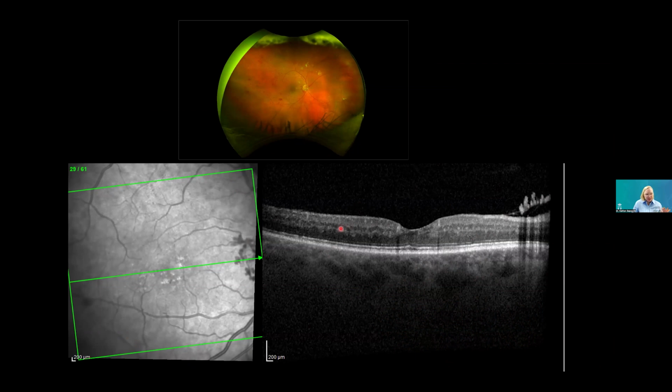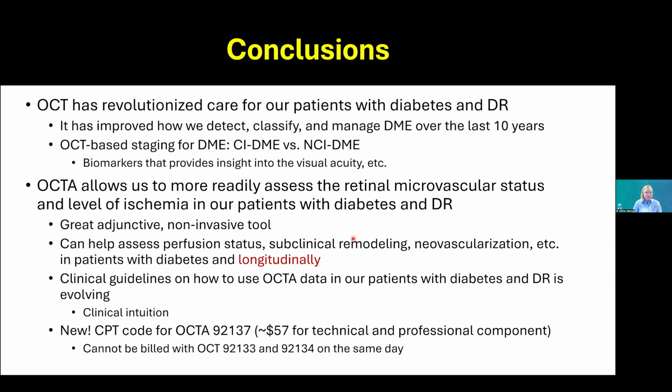So I think if you just take the extra time when you have it, of course, to go through this stuff, especially in these very vision-threatening cases, OCT can be a very powerful tool for patients. Most people sort of understand a cross-section or the term biopsy, and so this really helps give them some insight into what's going on with their tissue.